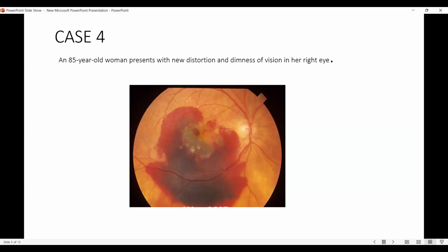But with this kind of picture, along with drusen, melanoma may be a differential diagnosis, but it will be last on the list. Because this is not a mushroom-shaped lesion also. This is a subretinal hemorrhage. In old age patients, if there is subretinal hemorrhage in the macula, the first differential would be CNVM due to wet AMD. It can be IPCV also, but wet AMD or IPCV or similar things, not melanoma. Okay. Thank you. Excuse me, I also have a query.